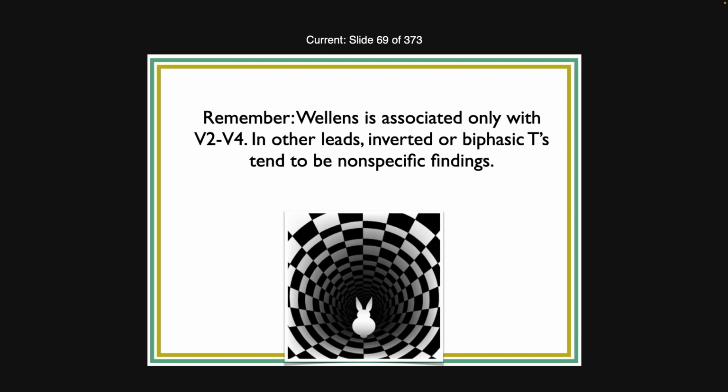So again, it's very specifically there. Other leads tend to be non-specific findings. When they say non-specific, what that really means is, who knows? We don't know for sure.